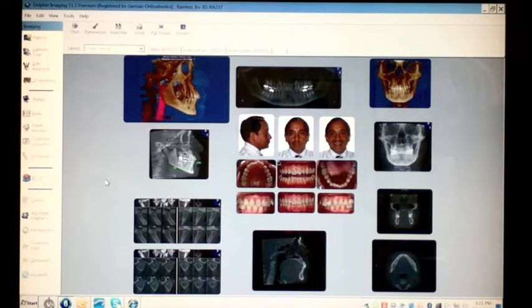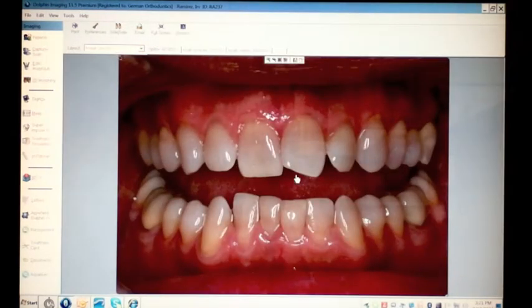What you're viewing is the template that we developed and published in the 2010 journal. This is the montage of pictures that we use on all of our new patients, and the same montage that we use on our final records. I don't need to spend time reviewing the information contained within the photographs. However, I would like to point out that this is one of our favorite images to study. Teeth separated, with the lips retracted from the soft tissues, and then we're able to evaluate all of the hard tissues as well as the soft tissues to help determine a vertical positioning of the teeth.